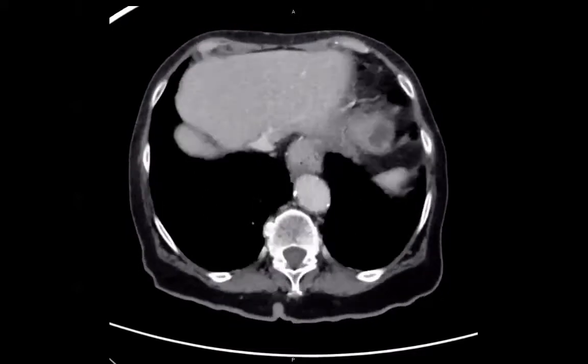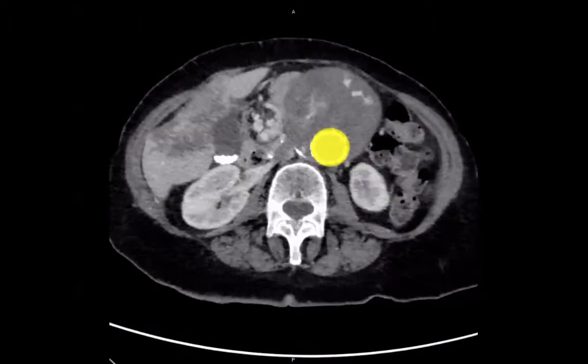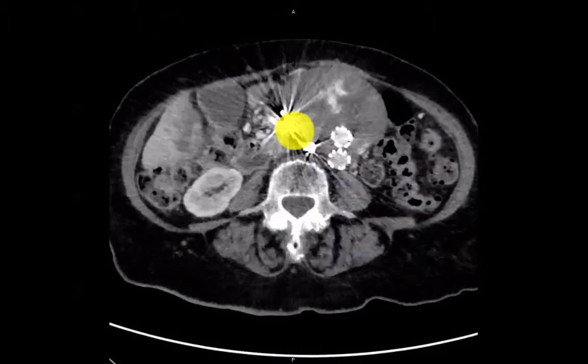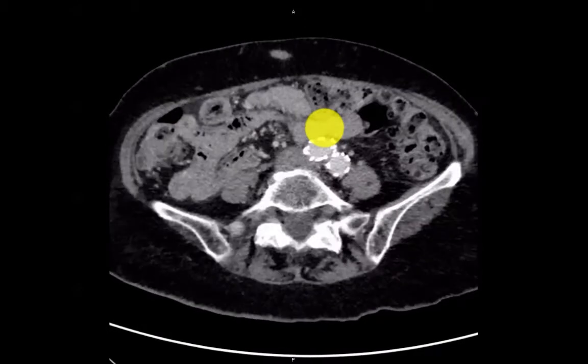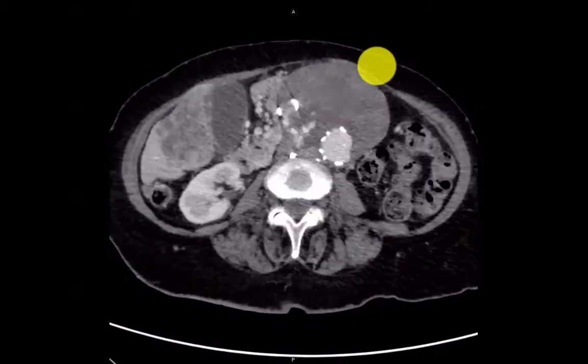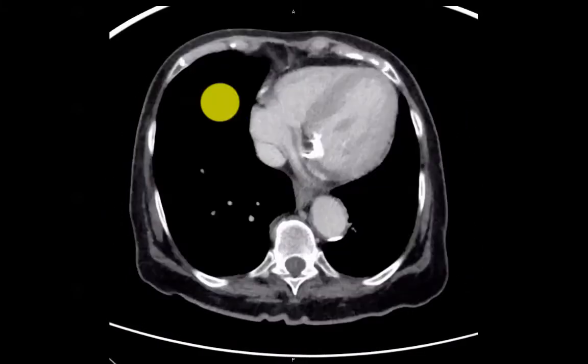And the patient ended up getting a contrasted CT scan, and you can see following the aorta down, here's the graft material. There is contrast extravasation into the aneurysm sac, signifying that there is an endo leak present. Now there's some other stuff going on, obviously, in the patient's liver there too. So to reiterate, you can still look at that sac in a patient with an endograft repair. If it's bigger, that is really concerning.